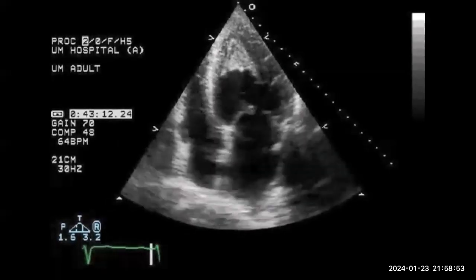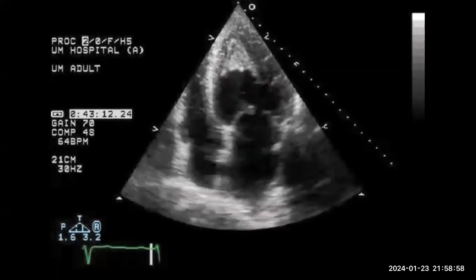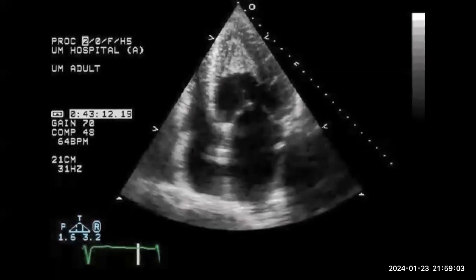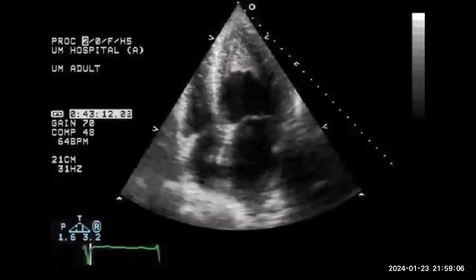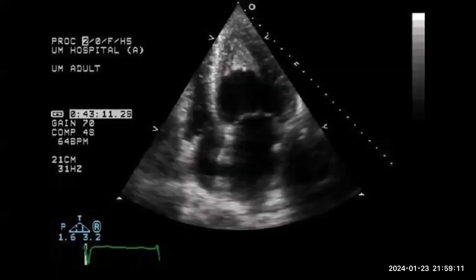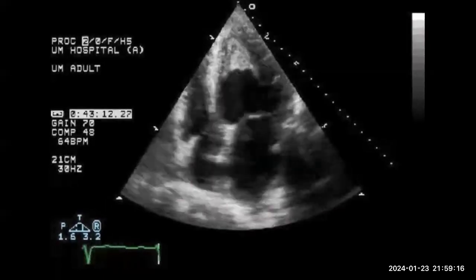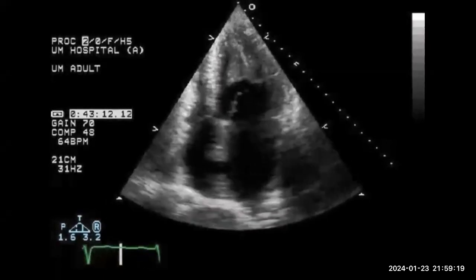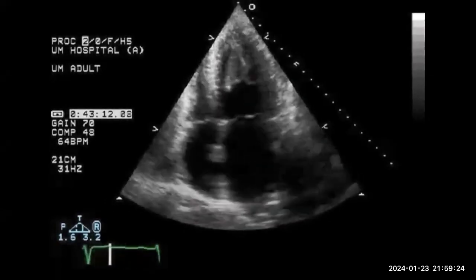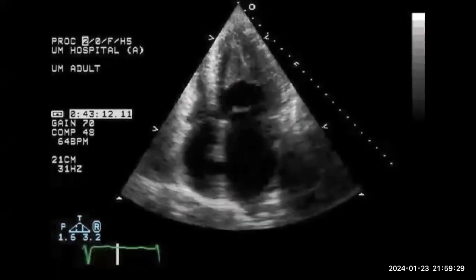Okay, thrombus could be one of the differentials. Okay, excellent. Fabry disease. Fabry is not really. Loeffler. Loeffler is the hypereosinophilic. What other? Endomyocardial fibrosis. They are all the same thing, endomyocardial. Could they consider apical HOCM? Excellent. Apical HOCM. And you are talking about something that occupies your apex. You need to have more views. You need a sonoview or contrast study just to differentiate between them.